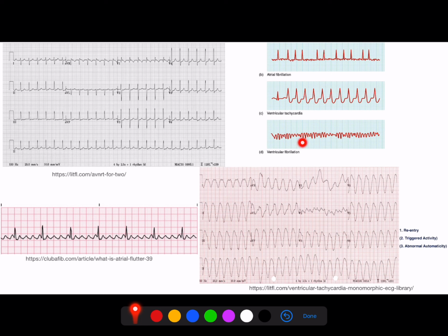And in ventricular fibrillation, we have basically the same mechanism, but we have many places of re-entry tachycardias at many points. So we have many closed conduction loops at many points of the ventricles. So the amplitudes are not the same as in the ventricular tachycardia, but they are different, and the heart at that point pumps very, very insufficiently.